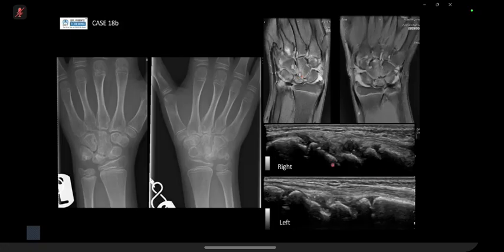Now, on ultrasound, this is your classic view of your wrist joint, the radiocarpal joint in the midline of your wrist, and the black bit shows synovial thickening. The only bit that I didn't give you was the Doppler, which would show vascularity, suggesting it's active synovitis. In arthritis in a child, if you just had treatment, you can have a lack of Doppler vascularity, but you still have synovial thickening persisting for a bit until the treatment starts to kick in. But you can notice that on the right side, it is a lot worse than the left, which corresponds with what the patient's symptoms are.